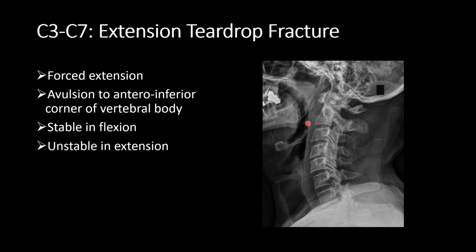There's, I think, a bit of soft tissue swelling in front of C2, but if you actually look at C3, there's no soft tissue swelling. So this indicates that the pre-vertebral soft tissue line is not a sensitive line. So a normal pre-vertebral soft tissue line does not exclude an injury.